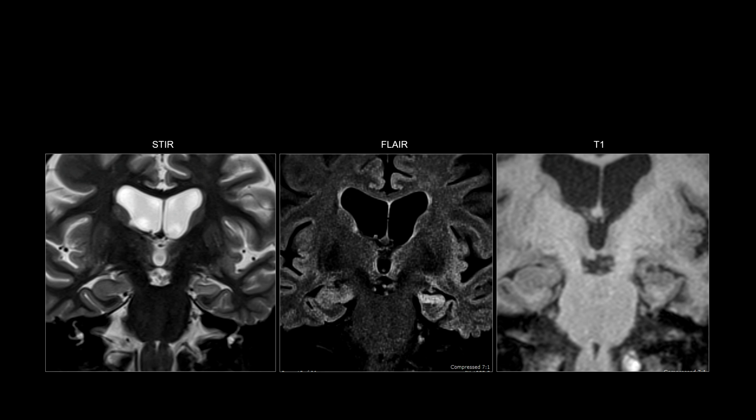Focusing on the left temporal lobe, I think some of you already noticed that the left hippocampus looks very different from the right hippocampus in that it is smaller, so more atrophic. And on FLAIR, you can see the left hippocampus also looks brighter compared to the right. So this is an example of medial temporal sclerosis, and we'll come back to this as part of our anatomy talk.